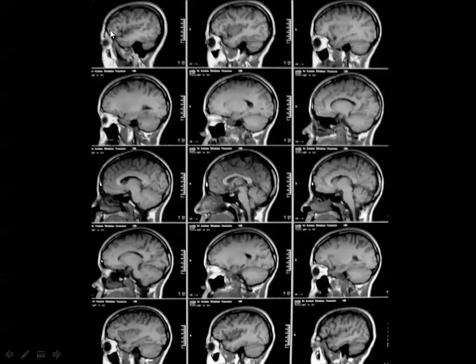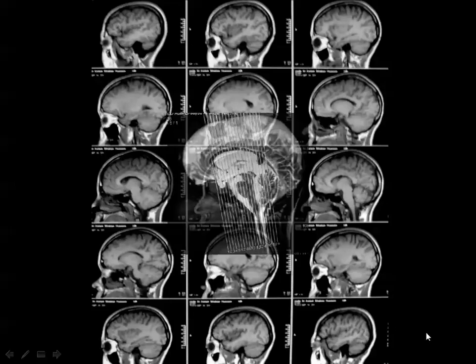So this is the left frontal lobe, left parietal lobe, left temporal lobe, left cerebellum. And if you reach the midline, you cannot know exactly which lobe is this one, the left or the right. But in this image, which is frequently shown in the exams, if this part is annotated and you say that this is the frontal lobe and don't mention left or right, and this is the parietal lobe, this is the occipital lobe, and this is the cerebellum, midbrain, pons, and medulla oblongata.